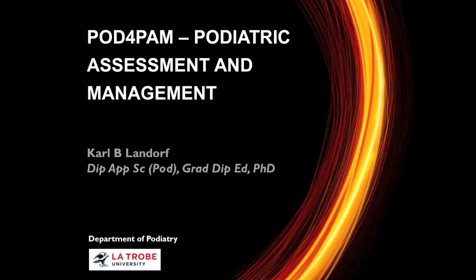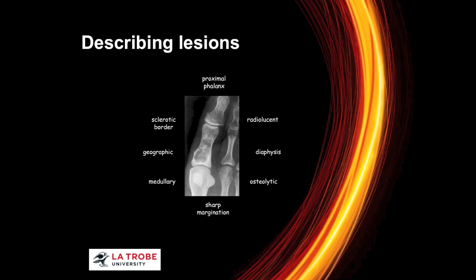Today, for your podiatric assessment and management, we'll be looking at describing lesions on X-rays and other imaging modalities, but in particular X-rays. Importantly, some of these principles that I'll go through today do cross over to some of the other medical imaging modalities such as CT scans and MRIs, but today will be predominantly focused on plain film X-rays.